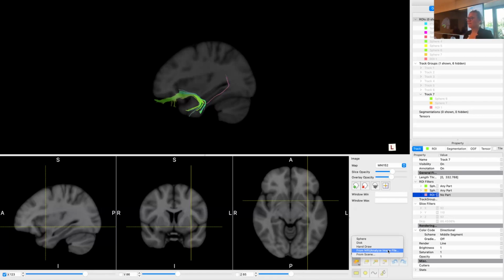How sensitive is it for subcortical structures and stuff? Is it also quite high? Or is it difficult? So if you think back to the corpus callosum that we did at the very beginning, the projections we had were anterior thalamic projections. So you can pick it up. It depends a little bit on the acquisition. So the quality of your data will determine how much and how well you can pick them up, but you usually get them.